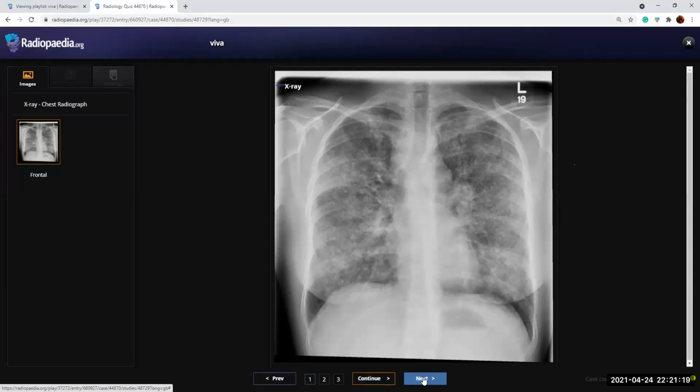This is a middle-aged male who is a smoker. Okay, so I'm presented with a frontal radiograph of the chest of a skeletally mature male patient, and I can see that there are multiple scattered alveolar and interstitial opacities seen in both lung zones, and there are also nodular shadows seen within. Bronchiectatic changes are also seen. Also, there is a right paratracheal opacity, suggesting that there is also some lymphadenopathy. By looking at the ribs, I find that the ribs are within normal limits. I don't see any rib destruction or rib mass lesions. Cardiac size is normal, and both costophrenic angles are normal as well.